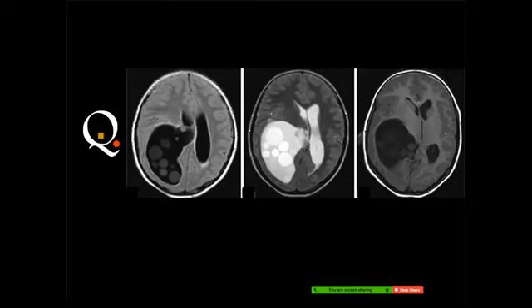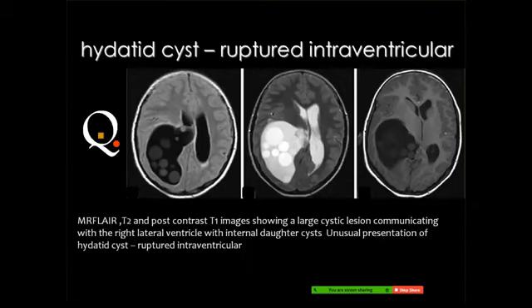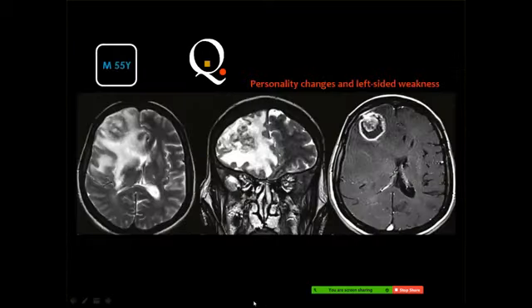Hydatid cyst. Yes, and this is an intraventricular hydatid cyst, classic appearance with daughter cysts inside the major one.